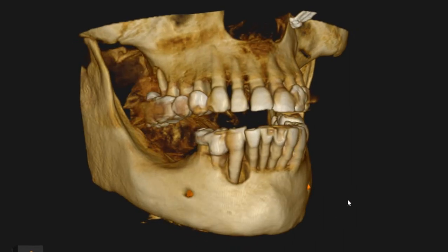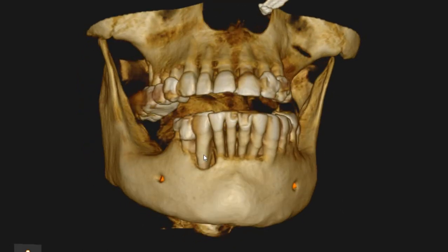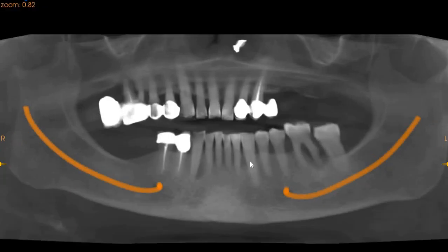The video report for your patient that you had requested, the area of interest is highlighted as the lower anterior teeth. This is the panoramic view. We can see that there is periodontal disease in the lower anteriors, and that periodontal disease is compromising from between the mesial of the lower left canine to the mesial of the lower right canine.